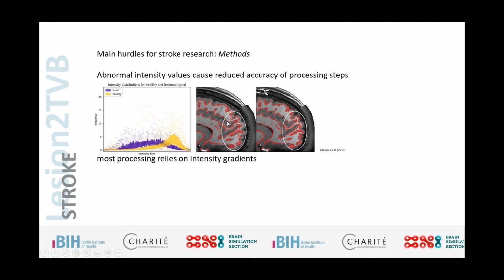There's a lot of white matter in the brain, and significantly less gray matter usually. So we have this strong bias towards the higher intensity values, the brighter values in the T1 images, as this is extracted from T1. And if we compare this to the lesion distribution, which is very flat and very broad, we can instantly see that these are significantly different distributions.